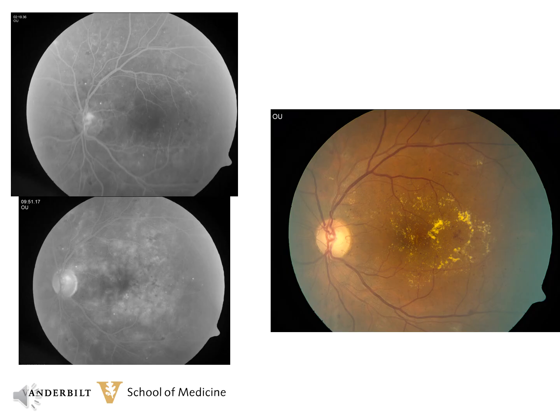The borders are very indistinct because there are no anatomical borders that limit the spread of the fluorescein. Obviously, you can get this type of interstitial staining from either branch vein occlusions and also in juxtafoveal telangiectasia.